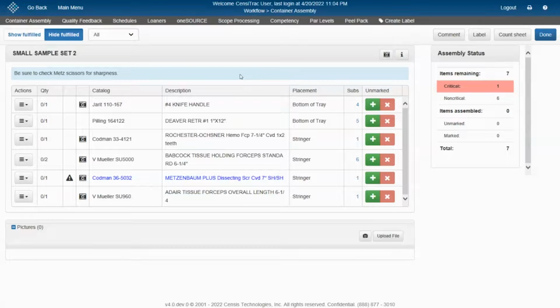This cross-reference tool will apply to all count sheets as well as all the instruments that are currently existing in a customer's database. It's important to note that this tool can also still be managed. So if there's any substitutes that come about due to the tool, those can still be disapproved or approved depending on the situation in the tray.